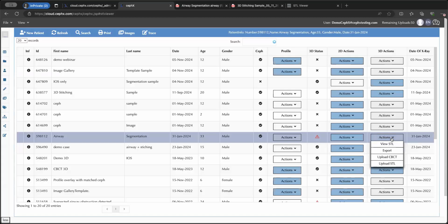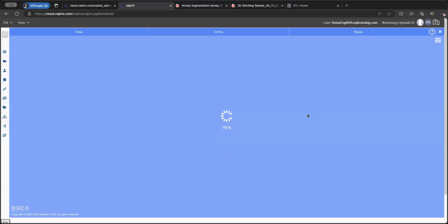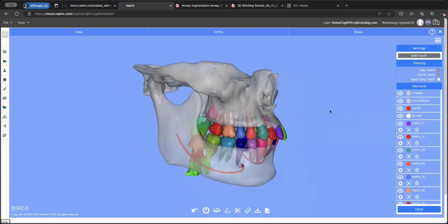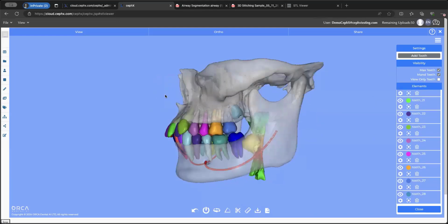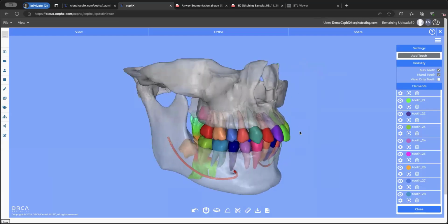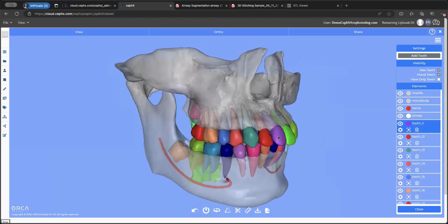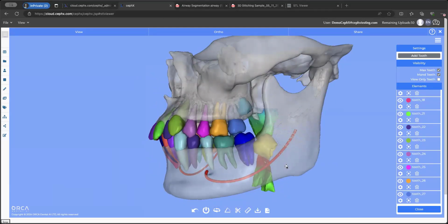And the same way with the 3D viewer. So going into the 3D viewer and being able to say to the patient, well, this is your anatomy, and if you have an impaction or wisdom teeth that you need to extract, it's very convenient to say to the patient, this is you. We're looking at this tooth or this tooth, and we might need to extract it, or we might need to move it. Very, very convenient. So yeah, important point.